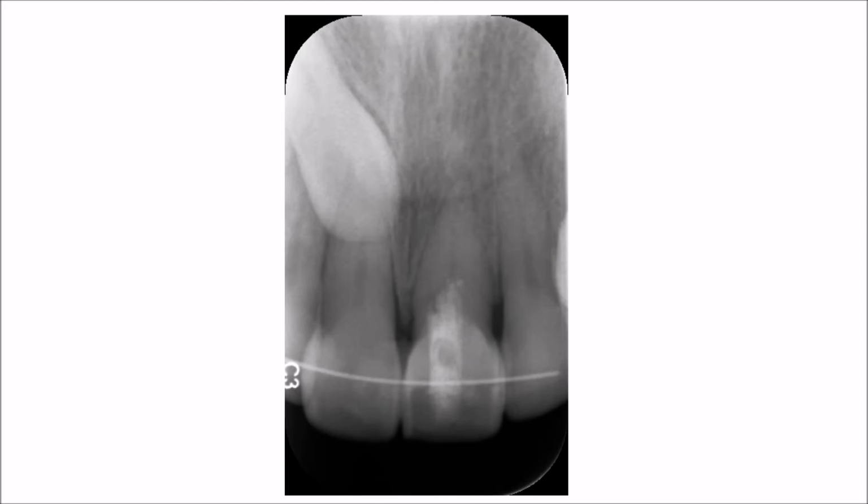So as you can see here in this periapical radiograph of central incisors and lateral, and shows an impacted tooth. Actually, we're not interested in the impacted tooth in this particular radiograph. What we are more concerned about is how to understand the appearance of a normal alveolar bone crest in the anterior teeth.